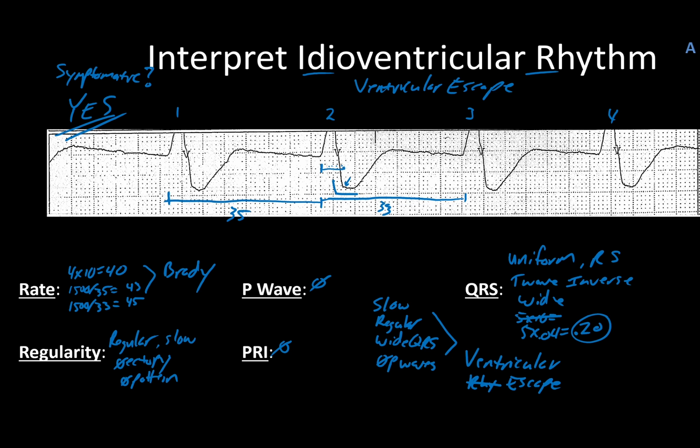I bring these forward because it is very beneficial when you can find the opportunity to look at strips like these that represent what a dying heart looks like, what happens when a heart ceases to function normally. Because that will help you identify rhythms faster and improve your judgment and reaction time, so that when something like this happens suddenly, you can immediately go, I know exactly why that's not good, and then intervene more quickly.